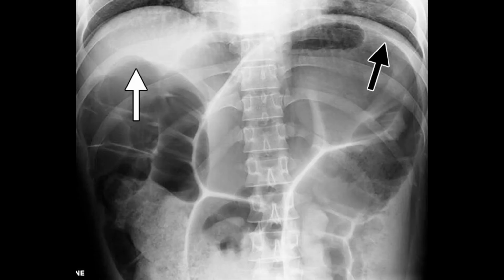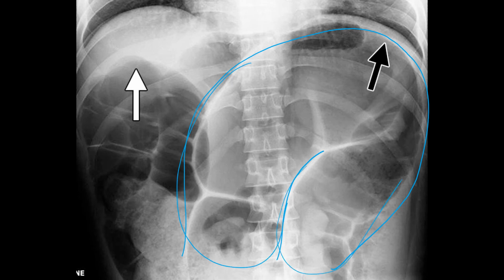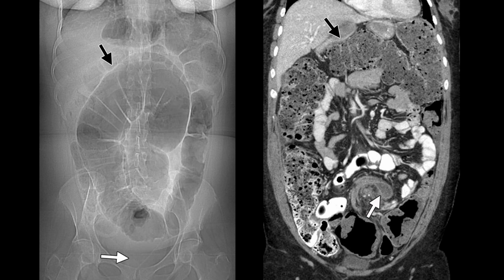So this is one more case in which we can see a grossly dilated bowel loop which is folding on itself. It appears almost like a coffee bean. So this is nothing but a sigmoid volvulus which is displacing the transverse colon and the ascending colon towards the right side. This appearance is called the northern exposure sign of the sigmoid volvulus.